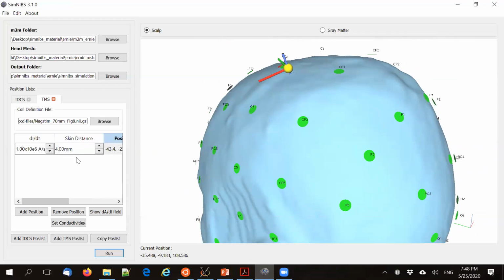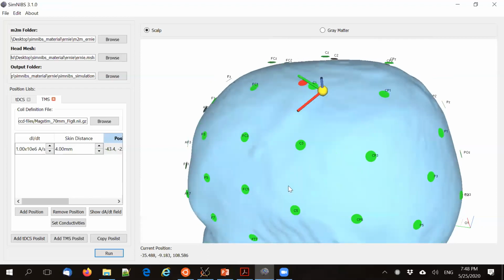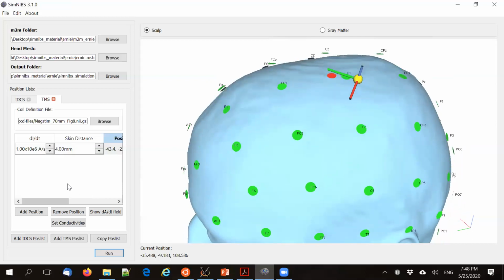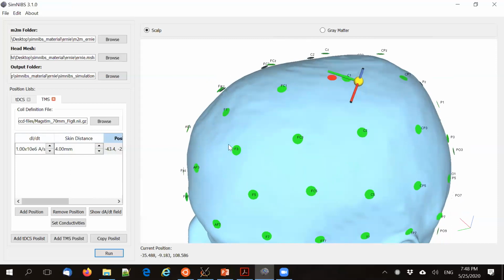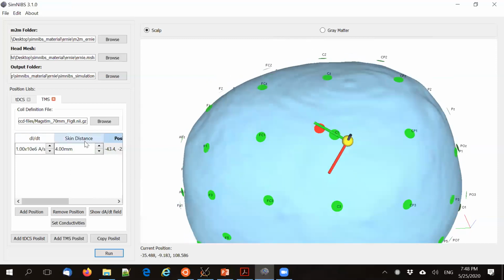The reason we do this is that we try to take into account that people obviously also have hair, or there might be some cap which they wear during stimulation, for example, to attach the DRF of the neuronavigation system. But feel free to alter that when you have more detailed information or when you think it's not appropriate. Just report it in your simulation results.